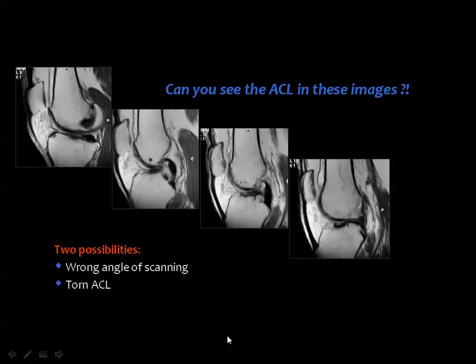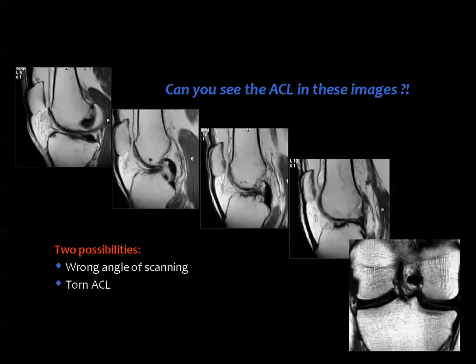In the beginning era of MRI, we used to bring the patient back and sit beside the technician to set the right angle for ACL identification. But now you can easily look in the coronal image at the intercondylar notch.